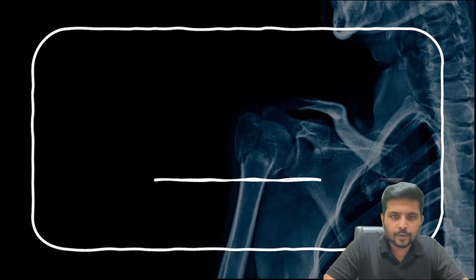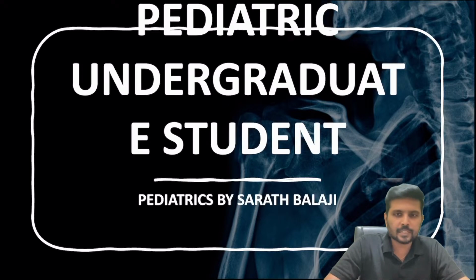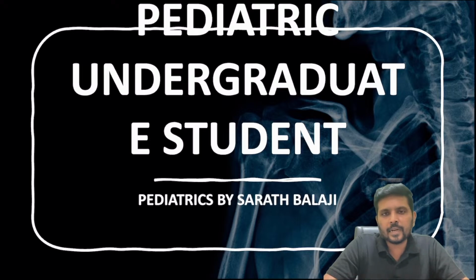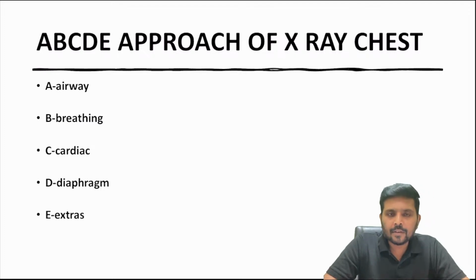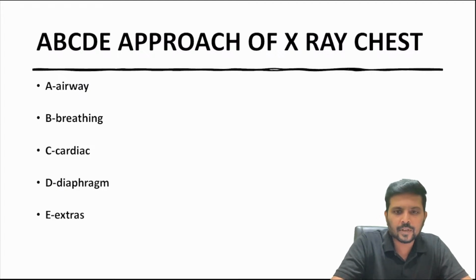Today we are going to discuss some important aspects in pediatric X-rays. This topic is mainly meant for pediatric undergraduate students. Whenever you want to read an X-ray chest, the following things should be given importance. What are all those things that should be given importance?